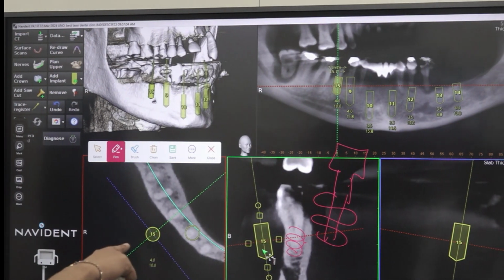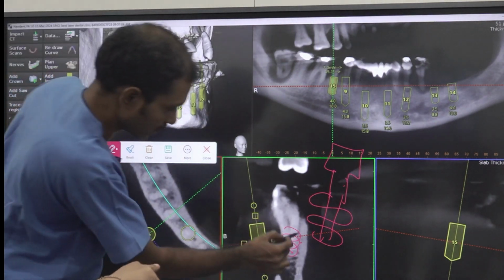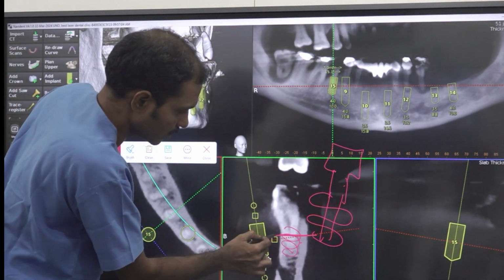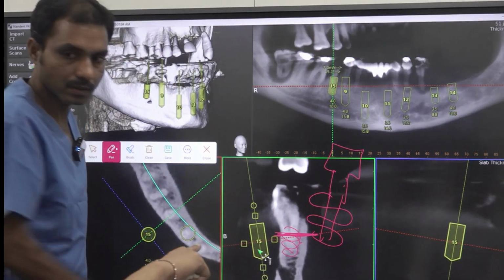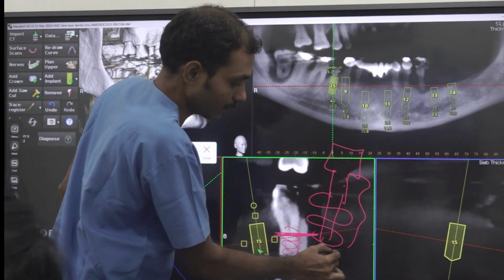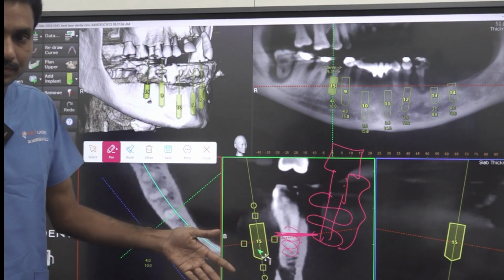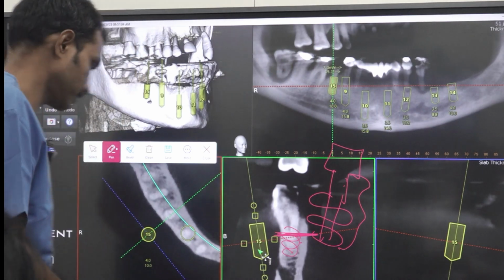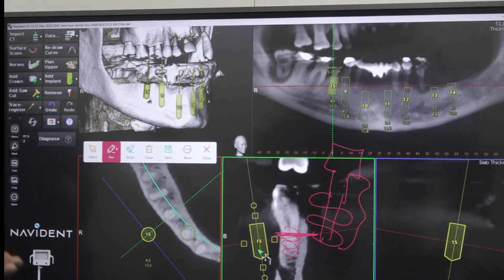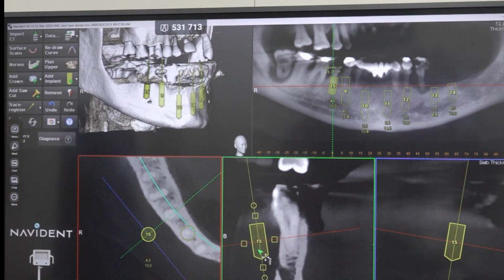So your calculation starts from where? In terms of length. Which one? The length. Okay. Just by imagination, no, you do alveoloplasty. No, sir. In the implant, where the start? Yes, from here to here. That I will tell you. Okay. In compression implants, it is different. Okay. In basal, it is different. Because in conventional, we have the shoulder and body. From there only we calculate here. Yes. This neck and size.